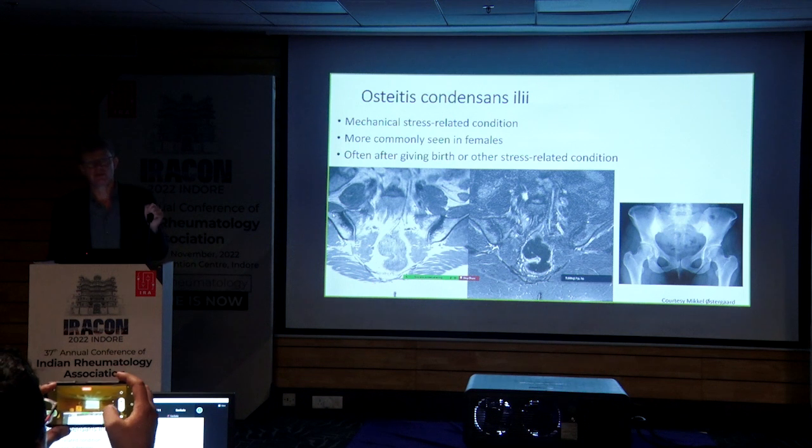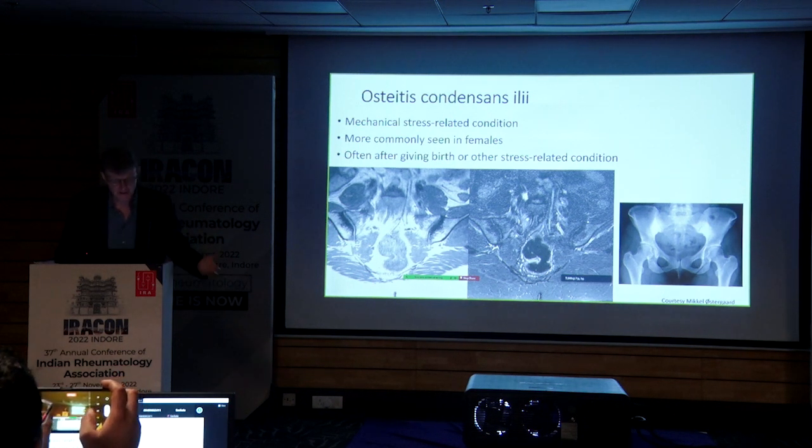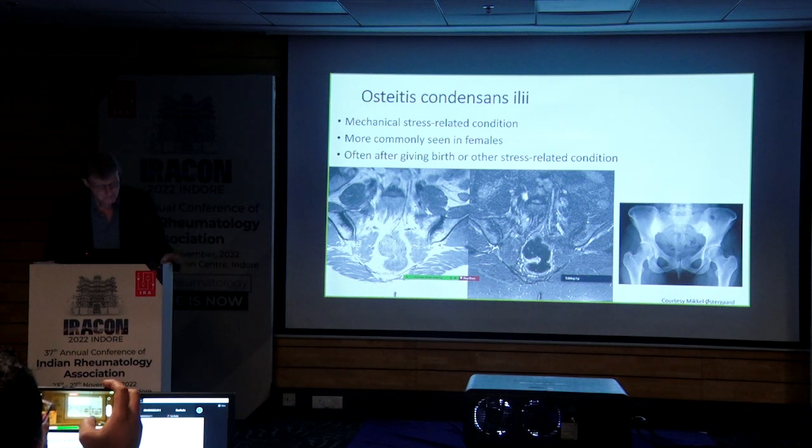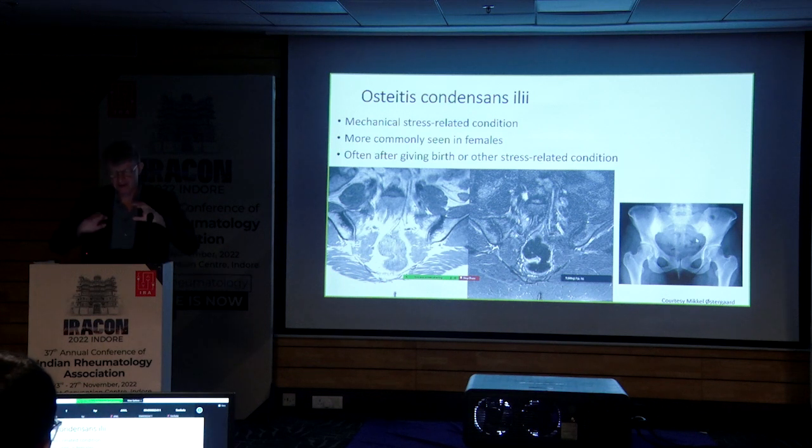It's not only women. There are studies that have shown that it can also be due to mechanical stress in men, but typically women. On x-rays, when it's enough of sclerosis, it's very easy to see also as this triangular part, which is actually in the upper anterior part of the joint, the anterior end, but on the radiographs, due to projections, it is localized like this, as this triangle.